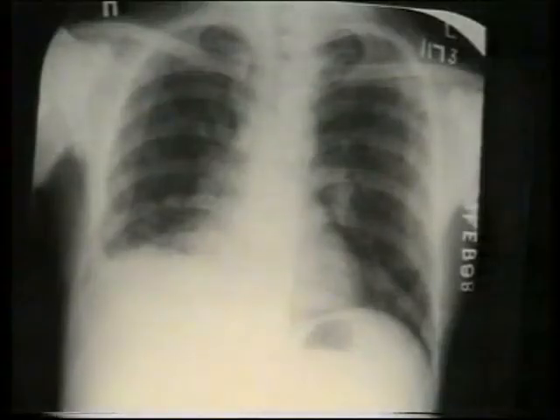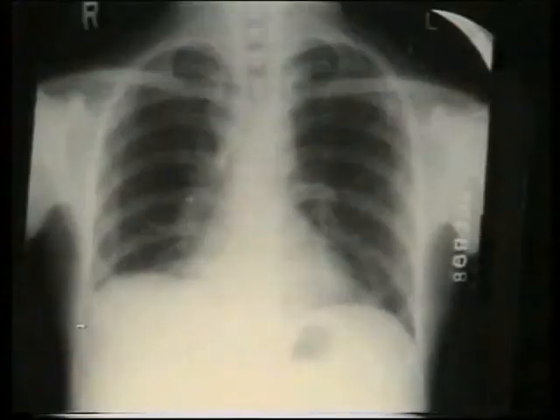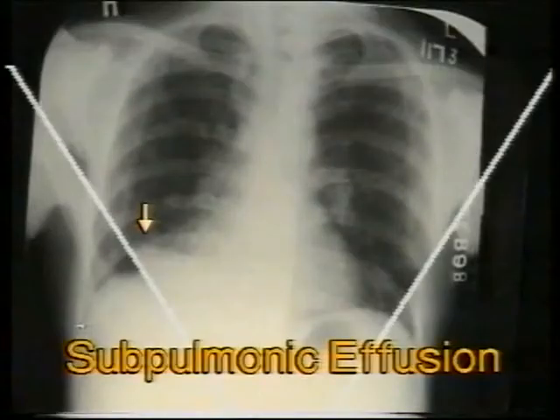Sometimes the fluid gets collected under the lower surface of the lung, between the lung and the diaphragm, and remains convex upwards. Note in this X-ray that the right diaphragm appears to be elevated with preservation of the costophrenic angle. This is termed as a subpulmonic effusion, an effusion under the lung. After aspiration of fluid, the true diaphragm is seen and the lower lobe of the lung has expanded. Let us compare the level of the diaphragm in the two pictures. The inner X-ray before aspiration shows the raised hemidiaphragm. A similar appearance may be seen in subphrenic abscess and diaphragmatic paralysis.